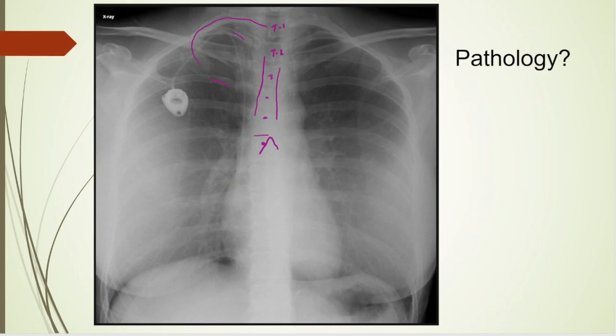All right, so that's airway. B for bones. Bones all look okay. C for cardiac silhouette. You can see it clearly. It looks good. D for diaphragm. Here's a diaphragm. This is breast tissue. This is scapula. A lot of people, when they first start reading chest X-rays, say, oh, there's pneumothorax, but it's just scapula. You can see lung markings all the way out on both sides.